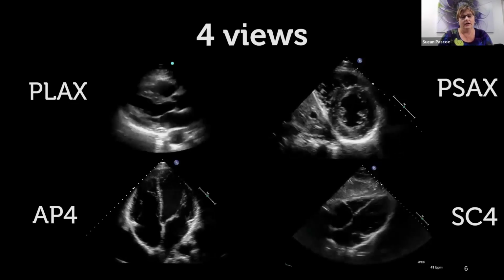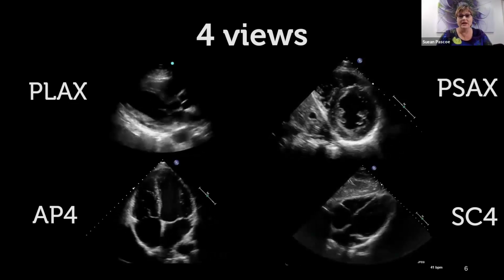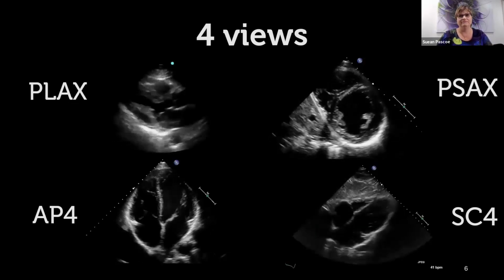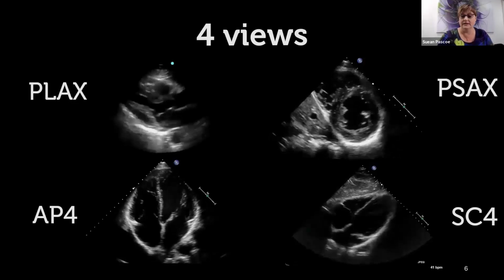Ideally, we are aiming for really good quality images, and we're always trying to do a better job. But there are times when even a very average view and one picture, not the whole 4 series, can tell us a whole lot and be very helpful in taking the right management decisions for your patients.